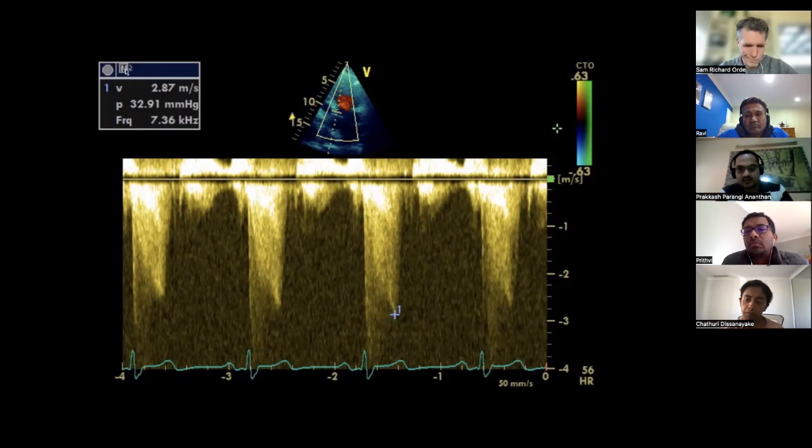Color Doppler to look at the MR jet, which I didn't quite see on the color flow Doppler earlier, but it could still be possible if we may not be picking up the color flow. And to differentiate on the continuous wave Doppler profile, mitral regurgitation occurs throughout the cycle, while in aortic stenosis and LVOT obstruction the Doppler profile has a pause, a small interval gap after which it starts.